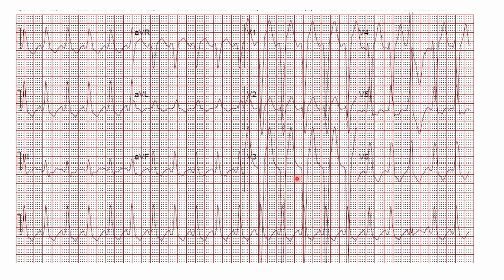If you have concordant ST changes, meaning ST depression in leads V1 through V3 or ST elevation in 1 or aVL, that is a STEMI. Now, the issue is that anterior STEMI from proximal LAD occlusion may only have ST elevation in leads V1 through V4, which would be discordant to the QRS without any concordant ST abnormality. Even inferior STEMI may only have discordant ST elevation with a down-looking QRS.